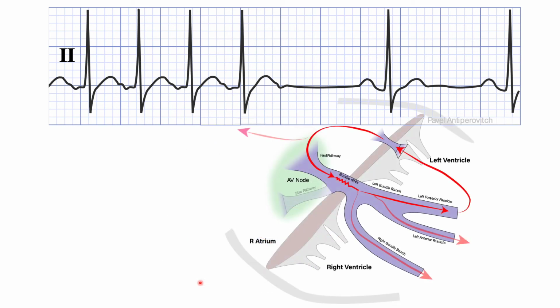Now let's look at AVRT. For AVRT to terminate on an atrial activation, the signal must travel down to the AV node, make a QRS, come back up the accessory pathway, make the last P wave, and then block in the AV node without making it to the ventricles. This is certainly a plausible explanation, and AVRT is certainly still on the differential diagnosis.